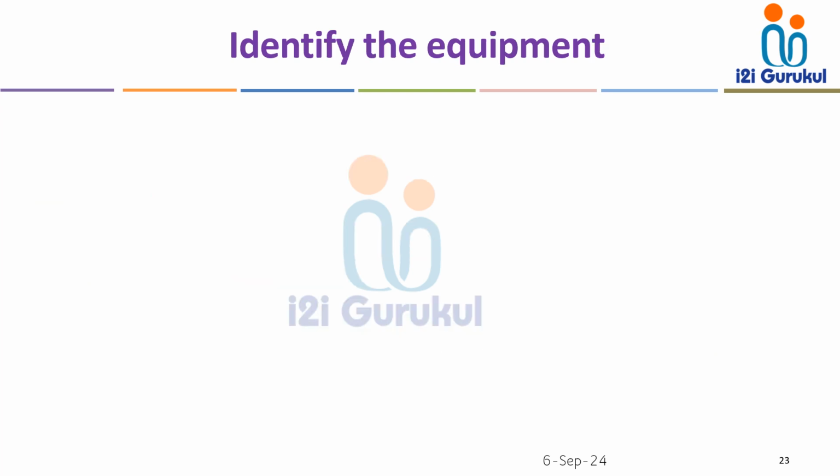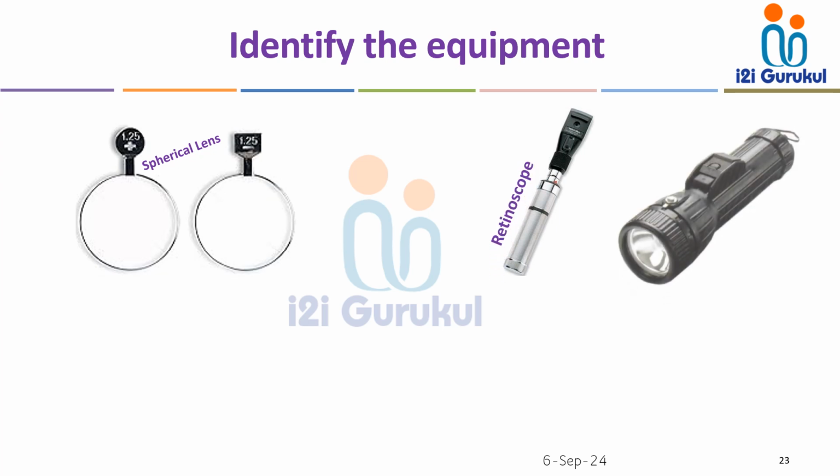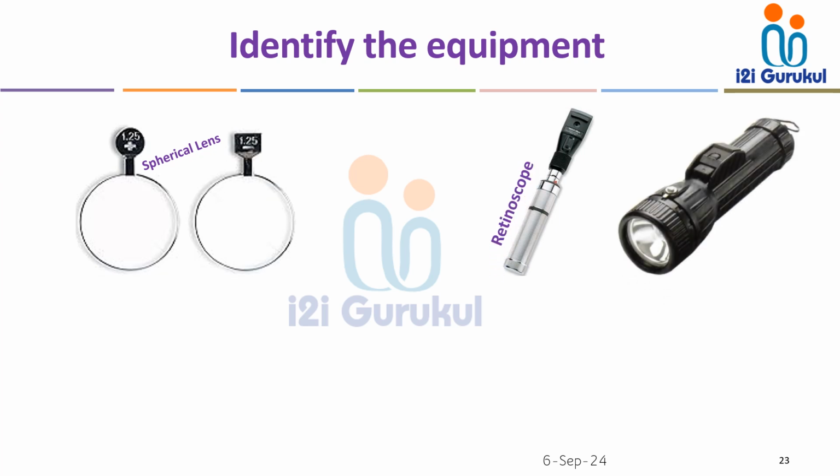Coming to identifying the equipment used in the refraction unit. You can see in the image, which type of lenses are these? These are spherical lenses. What about this? This is the retinoscope, streak retinoscope. And this one you know better. This is the torch we use in the refraction unit to check the ocular structures and for examination.